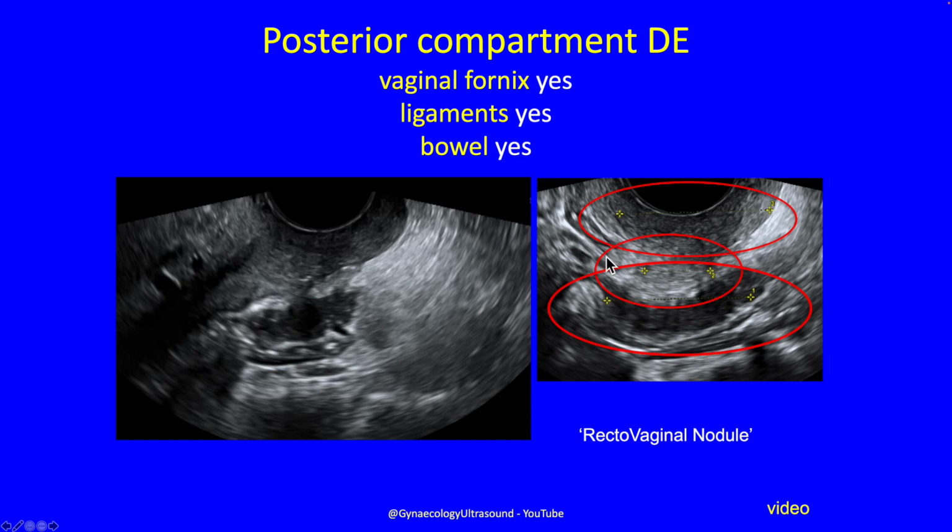If you have all three affected, very important to spot, that's called a rectovaginal nodule. That's palpable on digital examination. Very important for the surgeon to know this before they start, because this is very complex to remove.